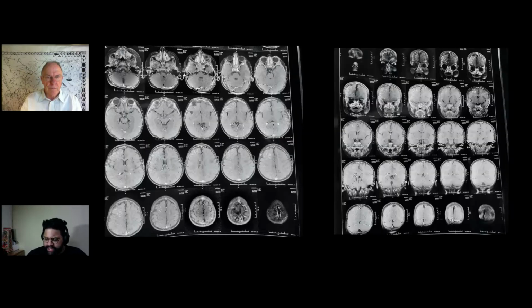So we have external films, and as you have seen in the previous case with Dr. Kavita, these are the post-contrast images, and you have these pial angiomas predominantly on the right cerebral hemisphere. These prominent transmedullary veins, as you can see over here, as linear areas. I think the left side also, the temporal and occipital region, demonstrate the enhancement pattern, which is typical for Sturge-Weber syndrome.